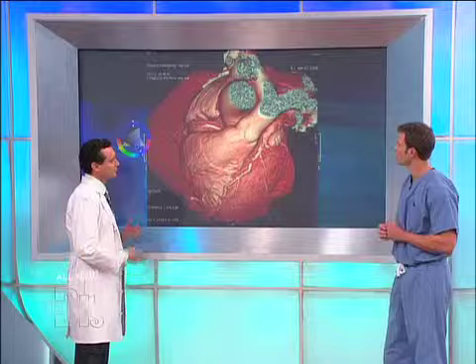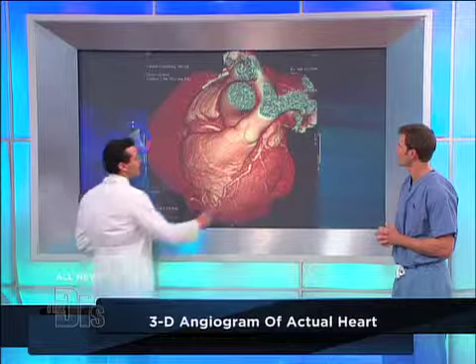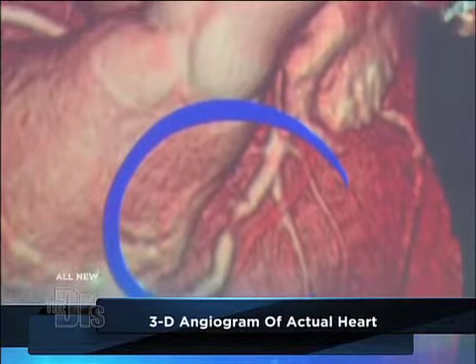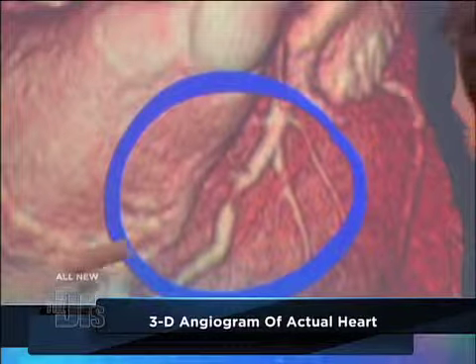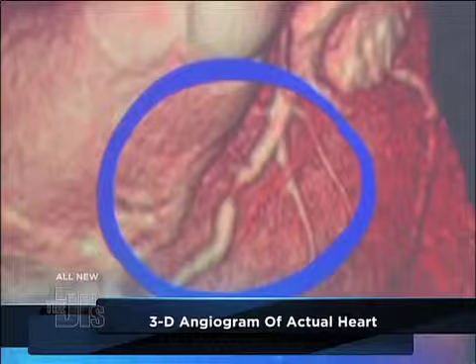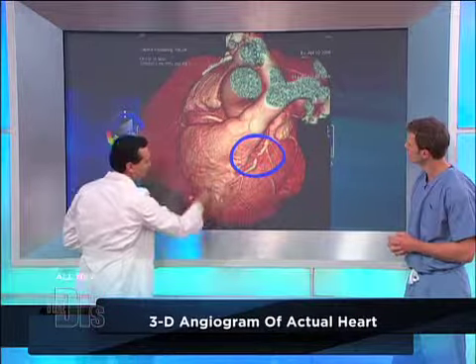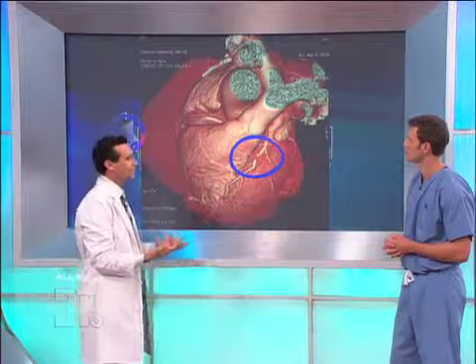Yeah, this is a person with what's called angina pectoris, or chest pain from a blocked artery. And in this picture of the cardiac CT angiogram, if you focus your attention here, you can see an hourglass narrowing. It looks just like an hourglass. See all that right in there, everyone? How it narrows down there? That's the narrowing you're discussing. That's right. And this blockage in the artery prevents blood flow to the downstream muscle and causes chest pain or shortness of breath, or angina pectoris.